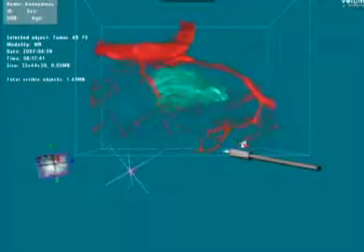And now if we rotate and look at the superior aspect of the tumor, there, perfect. You see that the superior aspect of the tumor is relatively smooth. It was our feeling preoperatively that this probably reflected a sulcal margin. This was actually confirmed intraoperatively.